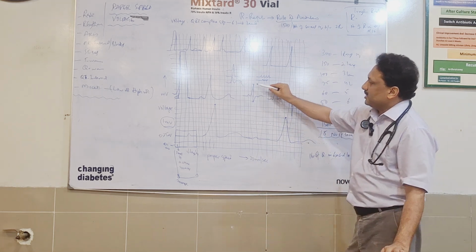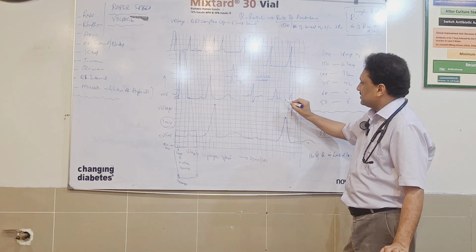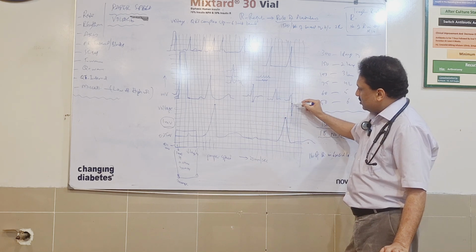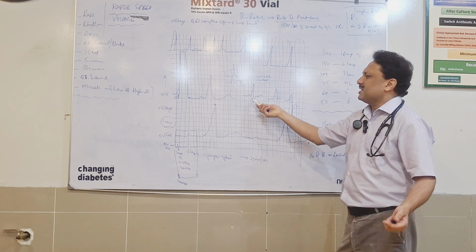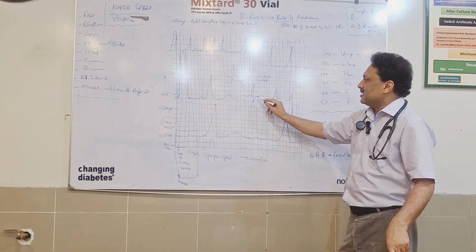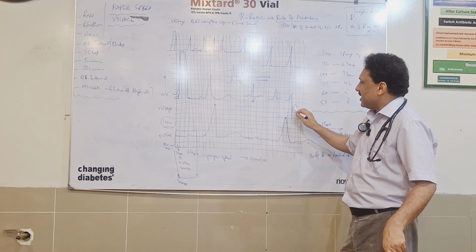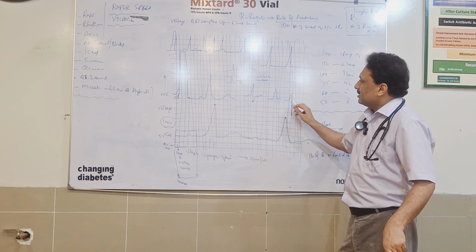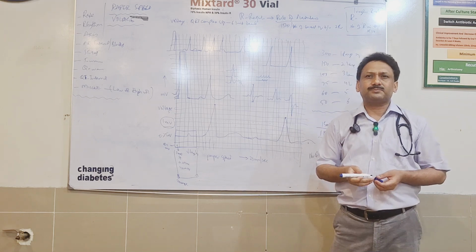Just keep on counting. This is 1, 2, 3, 4. This is 1, 2, 3, 4, plus 3, 7. This is 1, 2, 3, 4, 5. 7 plus 5, 12. And in the same way, say 3 other leads have the same size. So this would be 4 plus 5, 9 plus 3, 12. If we have 3 more leads of exactly the same size, it will be 24.